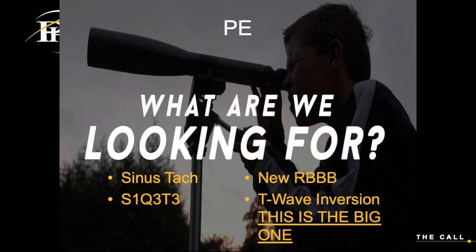That's what I was taught to look for by EKG gurus, but very, very intelligent people have discovered that S1Q3T3 is kind of garbage. It's only about 15% specific for PEs, so it's really not something that I look for, other than to be like, oh, look, there's that.